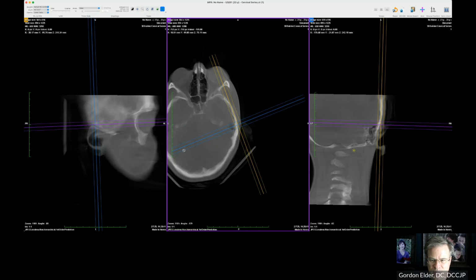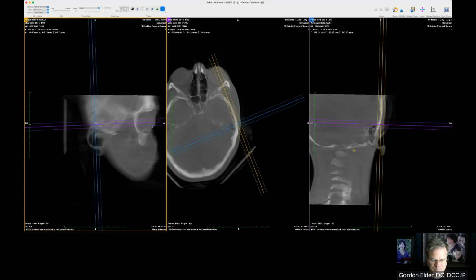Now, if you want to test me on that, you can play with it. But there's the eyelid. There's the spot behind the ear. Here's our reference line, so there's the hard palate. So we can see there's a difference of 4.3 degrees. So I'm going to take a picture of that. This is on the right side. That doesn't mean it's 4.3 degrees on the left side.